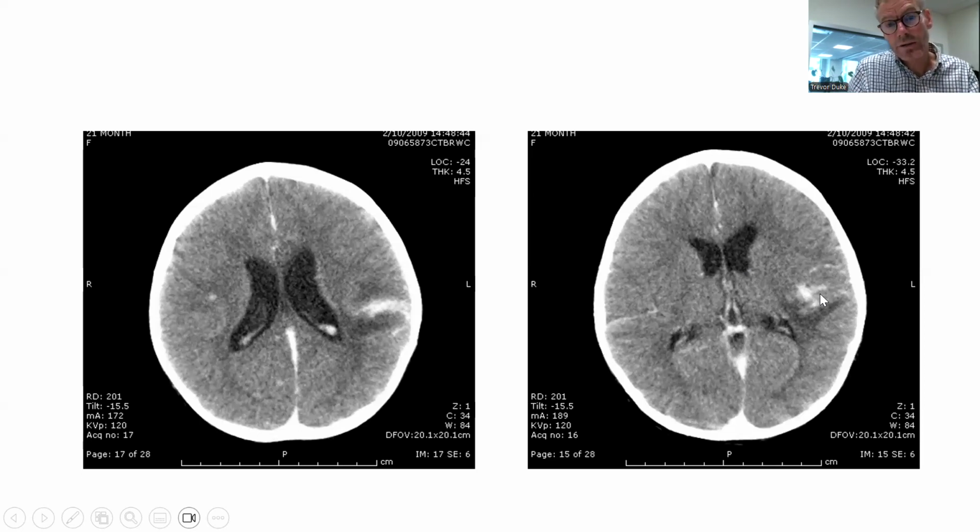And so often you see that when a child's got severe inflammation, or they've got a cerebral abscess with a capsule around it that is vascular, it lights up with contrast. So as I said, this is TB meningitis. The other areas of white in this, again, sometimes people overinterpret this. These are the choroid plexus that produces CSF. They're a bit calcified, so they produce cerebrospinal fluid, and that's a normal finding, just the choroid plexus being white like this.